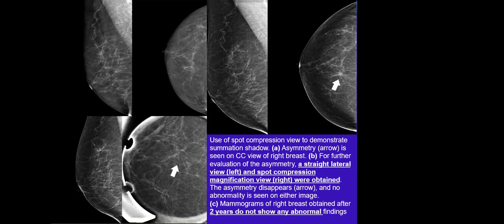When we have seen an area of asymmetric findings in a single view, we have to look in the other view, searching for the same area of asymmetric findings. Do you agree? Yes. We will be confident enough that it is definitely not in the other view.